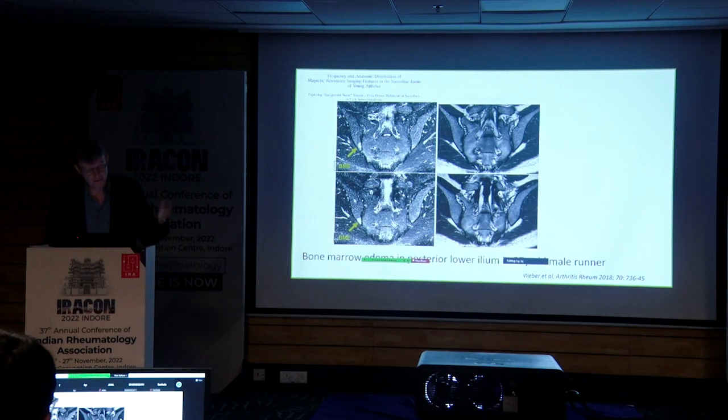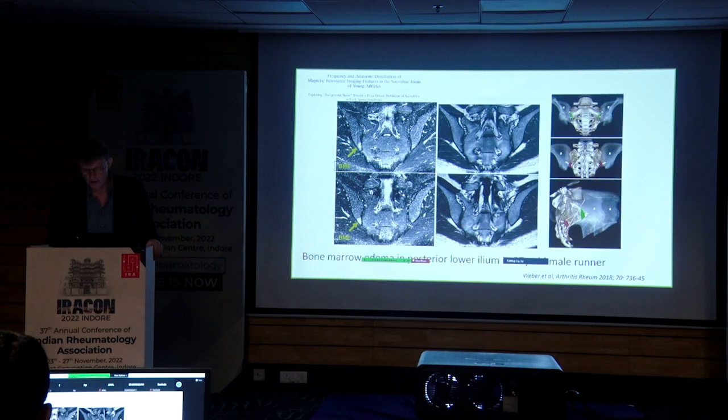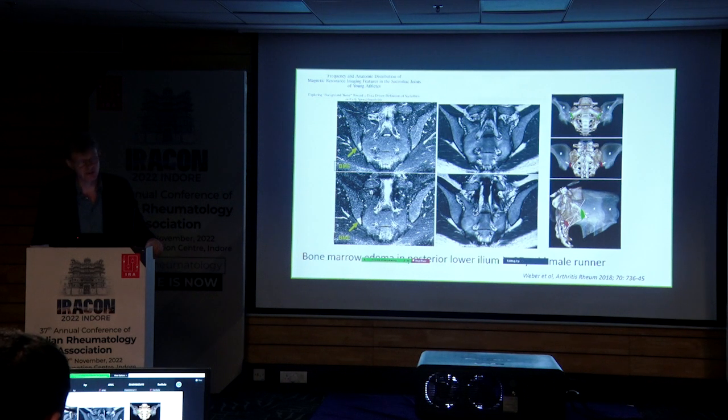And that could make you think the patient had actual SPA perhaps, because the patient may also have back pain. What he found also, and what has been confirmed in other studies, is that if here you have the sacral joint, the most common places to have unspecific changes related to stress, strain, giving birth, whatever, is in the upper anterior part of the joint and the lower posterior part of the joint.